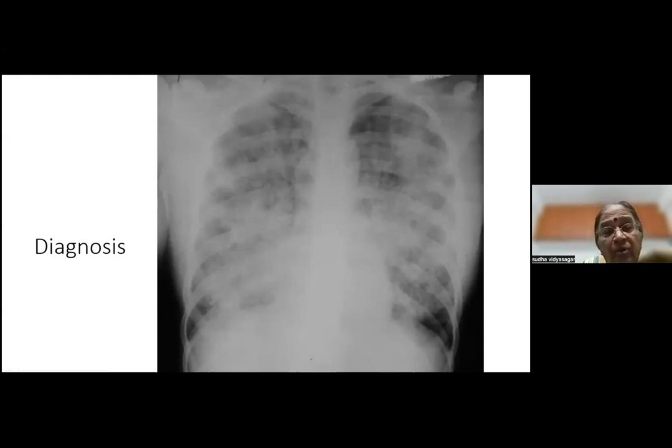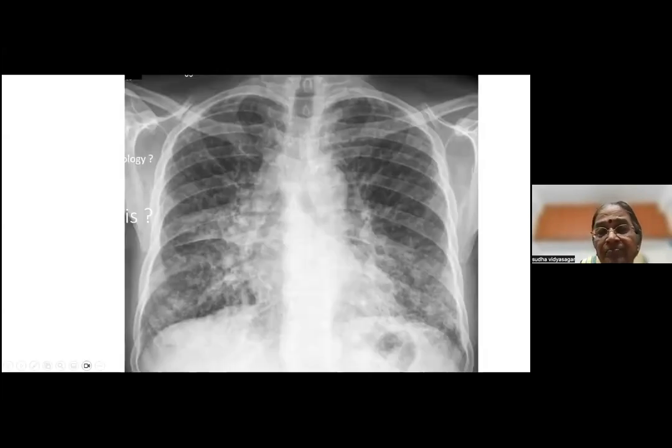It could be a bilateral pneumonia also. ARDS is a syndrome. So whether this person has ARDS or not, I don't know. We'll have to see whether he is hypoxic or not, and apply the Berlin criteria for that. This is definitely not a pulmonary edema because you don't have the crowding of these shadows close to the heart. It's not a bat-wing. It's scattered all over. So it's a bilateral extensive pneumonia. You could call it aspiration. You could call it cannonball, but there is a tendency for everything to look round, and we are not very sure. I wouldn't bet on it. I would probably call it bilateral inhomogeneous opacities and then take it from there based on the patient.